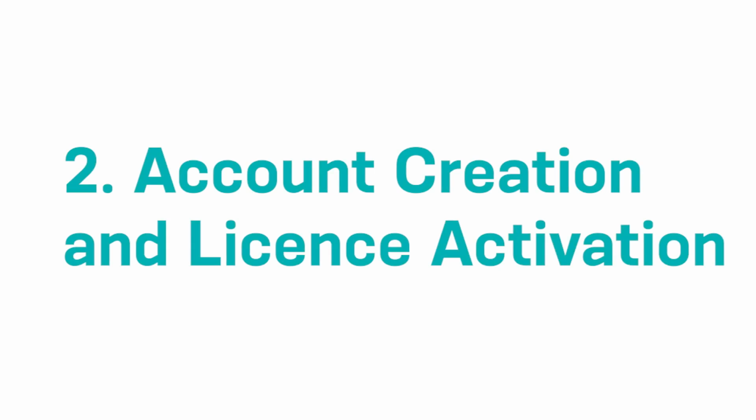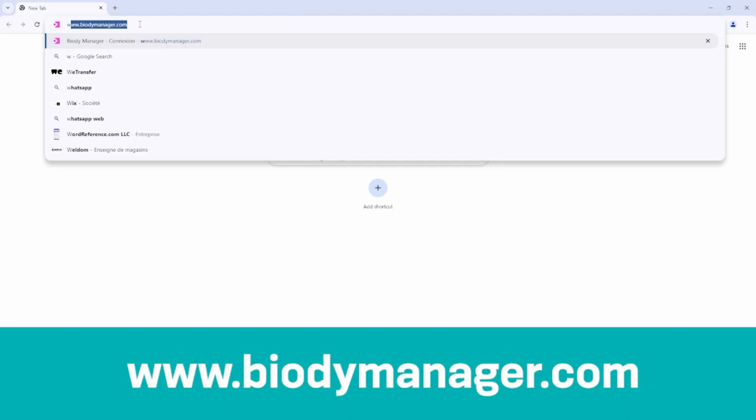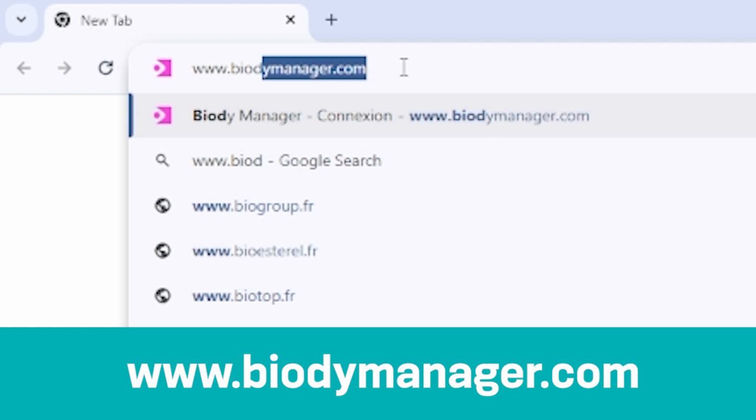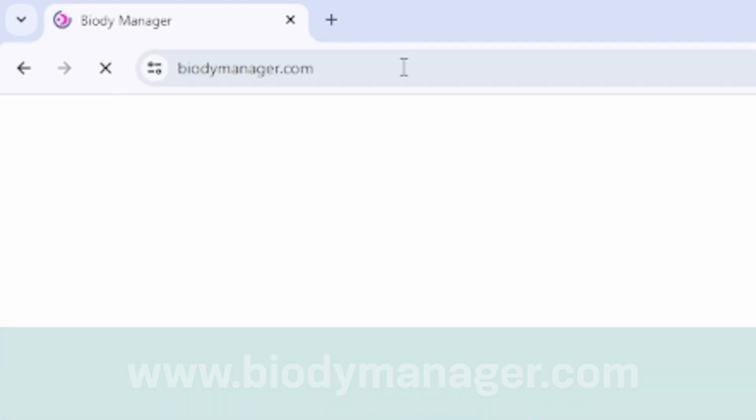Part 2. Account Creation and License Activation. Here, you will learn how to create your user account and activate the software license that enables your impedance meter to function. Go to www.biodymanager.com, the online platform where you can activate your license and create your professional user account.